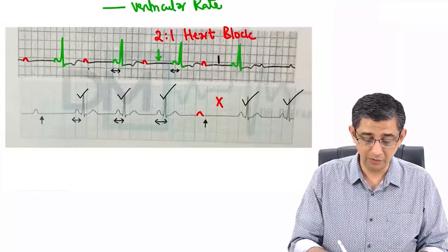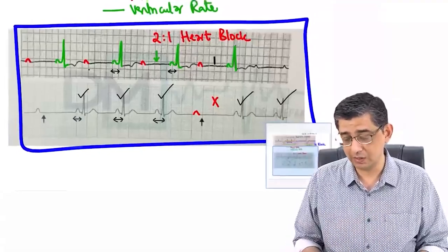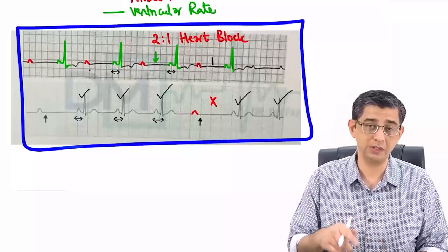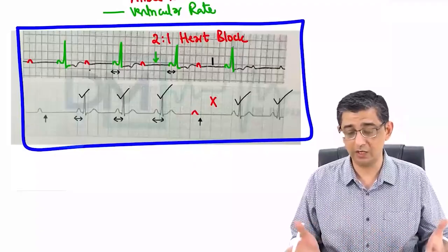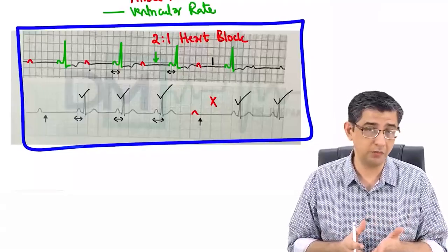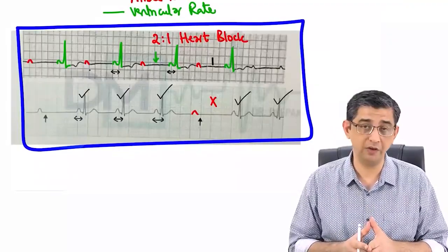In fact, with respect to Mobitz 2, I want to say that because Mobitz 2 and 2:1 heart block are confused a lot, you should either take a snapshot of it or hand draw the two rhythms by yourself. Again, I can highlight that your productivity and strike rate in questions will increase, because lots of times your rivals might casually answer what I just did, Mobitz 2 heart block, for the superior ECG. Why? Because the PR interval before and after is equal. Yes, this is a common source of error. That is why I personally feel that this is important for you to be aware of.